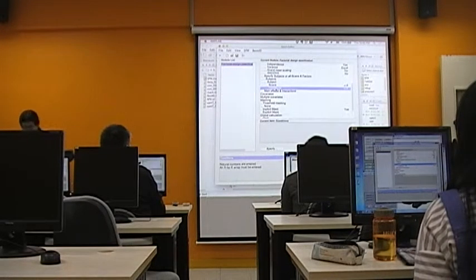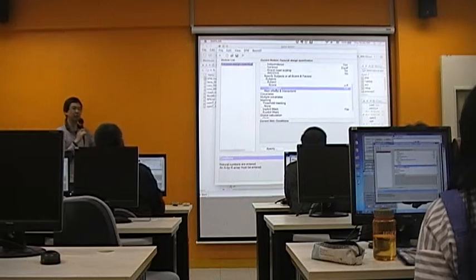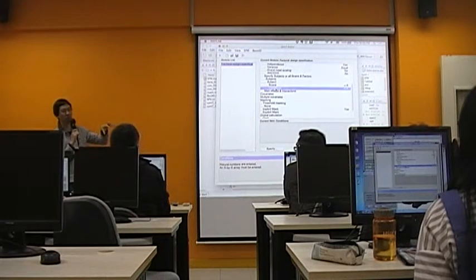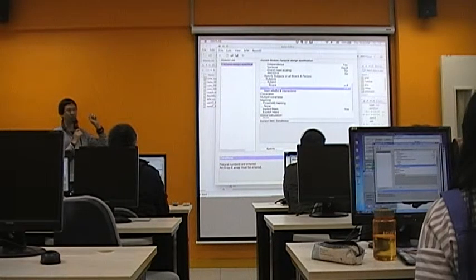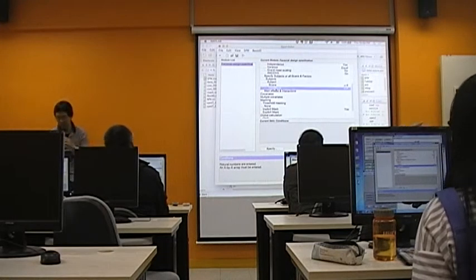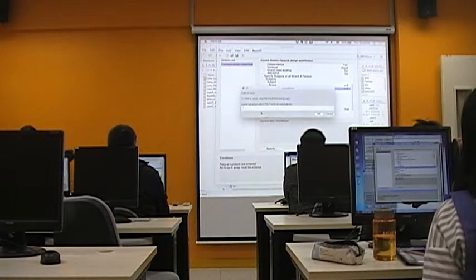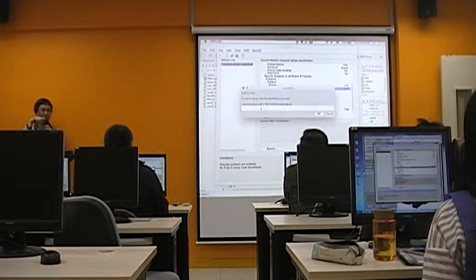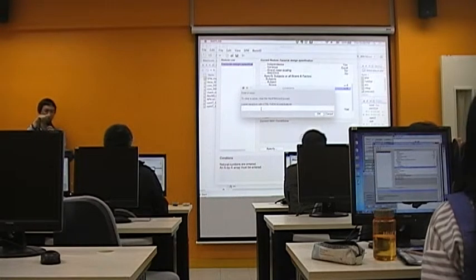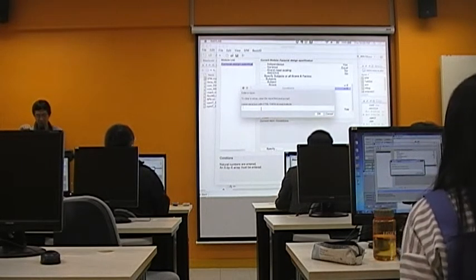And then you need to define the conditions. So you need to build a matrix to assign the respective condition to the images according to the sequence of entry. For example, if I'm entering the one back beta first, and then the two back beta, you need to keep that in mind. Let's take this as an example. You have two images. The first image belongs to the one back condition, and the second image belongs to the two back condition.